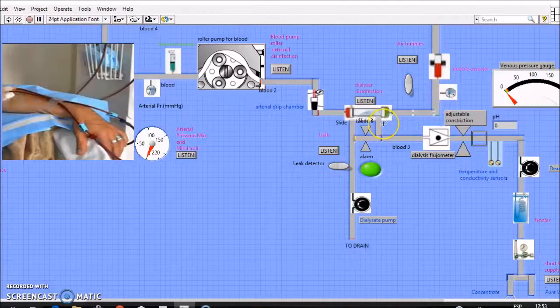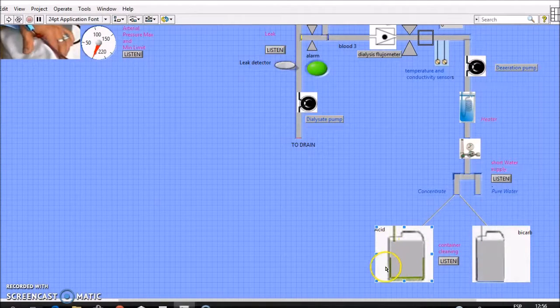A single patient hemodialysis system can be divided into three major components: the dialysis delivery system, the dialyzer, and the extracorporeal system. This is the concentrate mixture and conductivity control. The mixture of concentrate is made acid and bicarbonated, and the level of conductivity is controlled so that it is in the appropriate range. A solution of purified water with an electrolyte composition similar to that of blood.